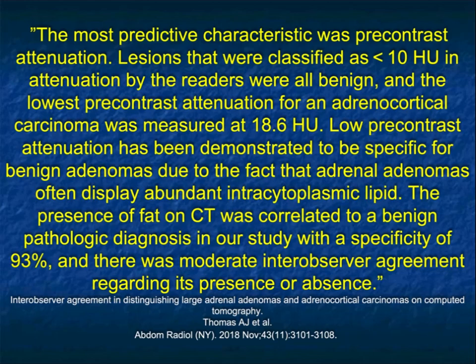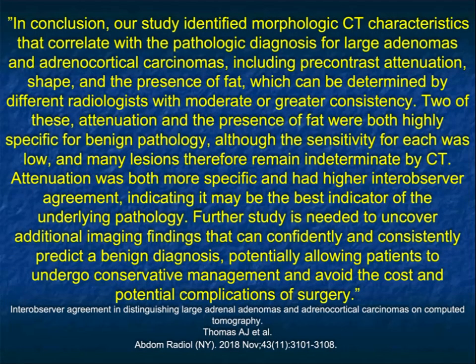So I don't worry about that. When I see fat in a lesion, it's typically going to be a myelolipoma. And I'll show you some of those as well.